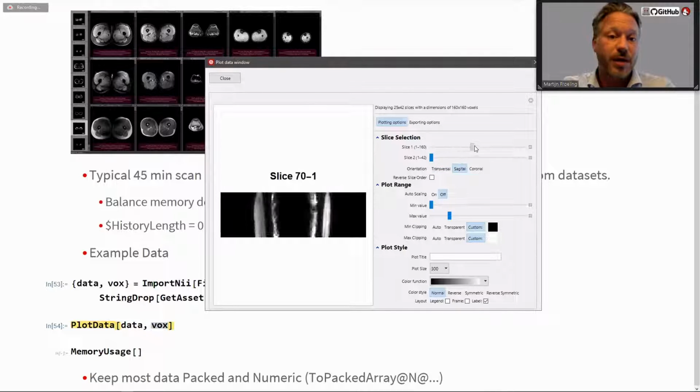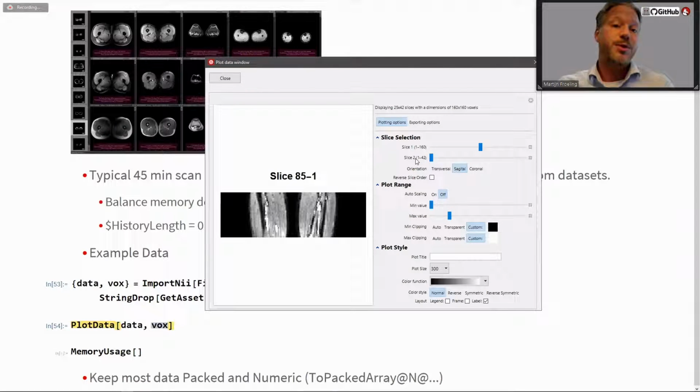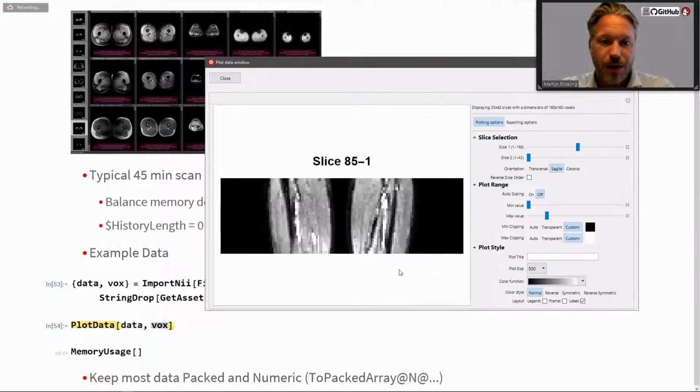And we can also look at it from different angles. So this is the side angle, for example, the same 42 volumes. So you can actually see it really represents 3D anatomy. So, and these voxels are actually anisotropic. So if you zoom in a bit, you can actually see that these things are not square anymore, but actually a little bit elongated.